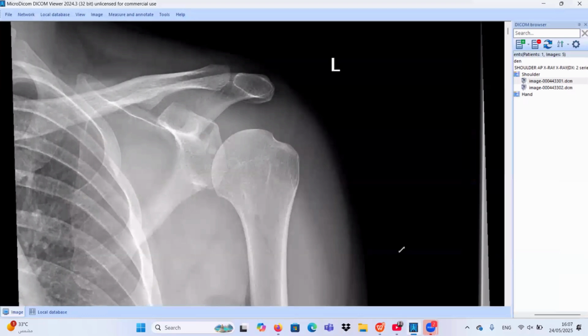Patient is presenting with shoulder instability. Okay, sir, I have an X-ray frontal view of a mature skeleton patient left shoulder. Although the glenohumeral joint looks intact at this view, the inferior aspect of the glenoid shows some bony fragments and cortical irregularity suggesting fracture, a bony Bankart. And according to the history you provided, sir, there is instability.